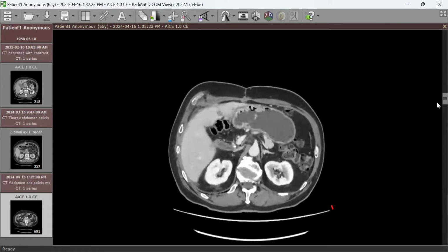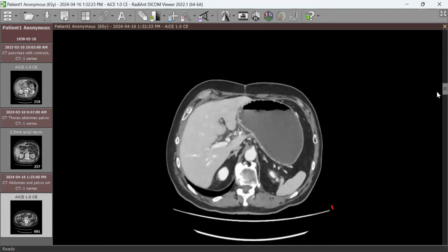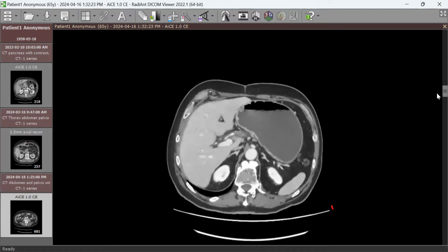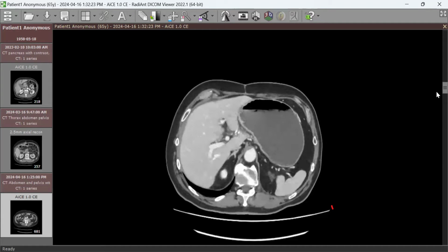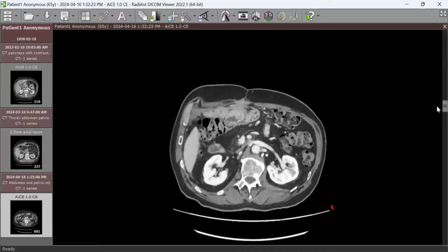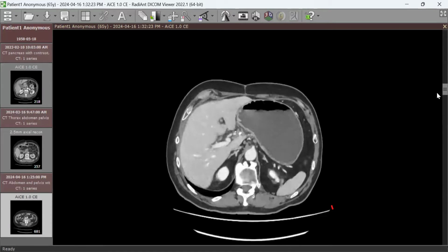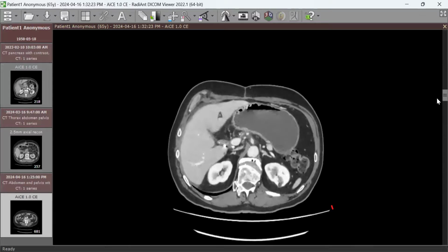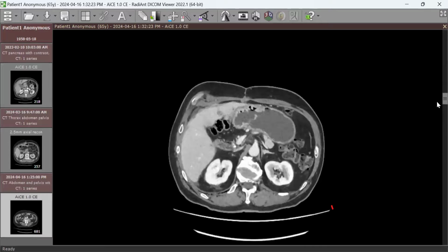Can you identify the type of surgery done for this patient? We mentioned all the elements. We mentioned there's no duodenum, first, second, third, there's no gallbladder. The pancreas, most of it is not here. So the cancer of pancreas, removed duodenum, and Whipple. Yes, that's Whipple procedure. Excellent. The patient had Whipple procedure for pancreatic cancer.